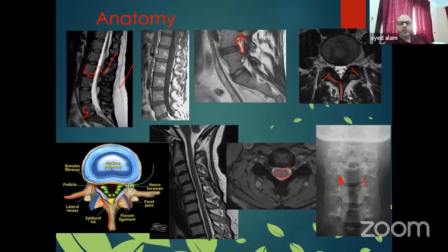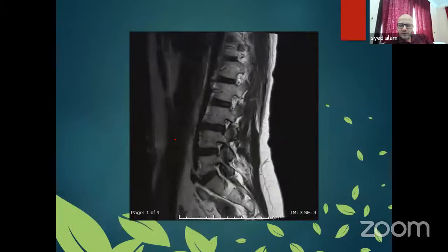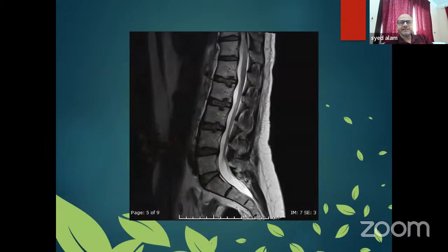You can see most of cervical and lumbar is almost the same. A little bit of difference I will tell you in my further talks. So now again, when we do MRI, it comes like this, from right to left we go like this. So here, again, this is because CSF is bright. Fat is bright, so this is T2 weighted sequence, and this is the vertebral body. This is the disc. So this is L5, S1, S2.